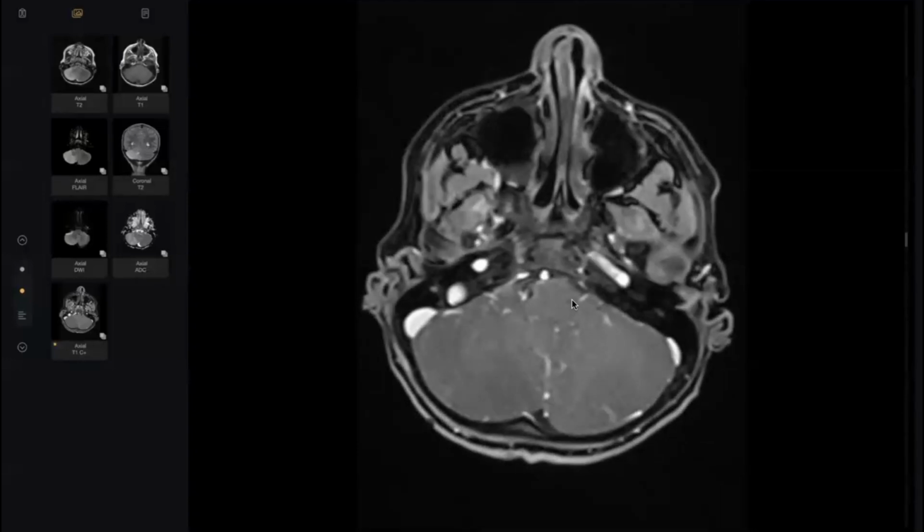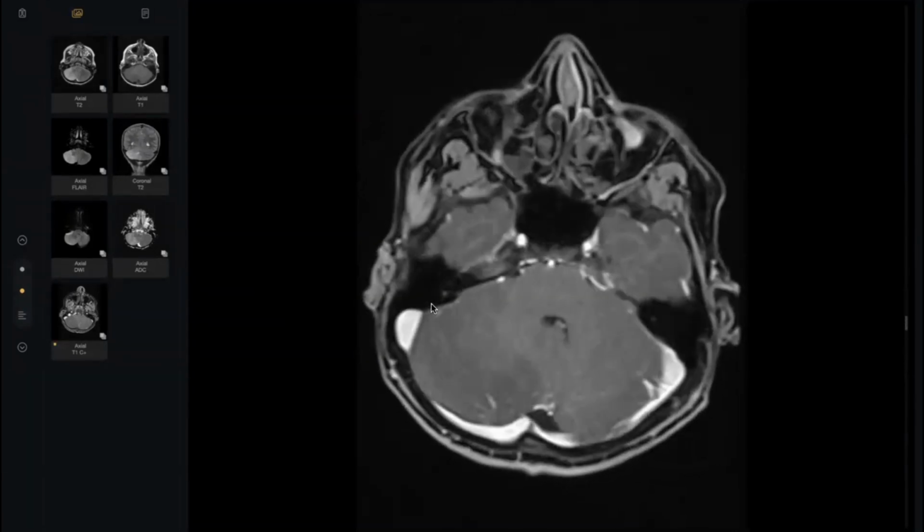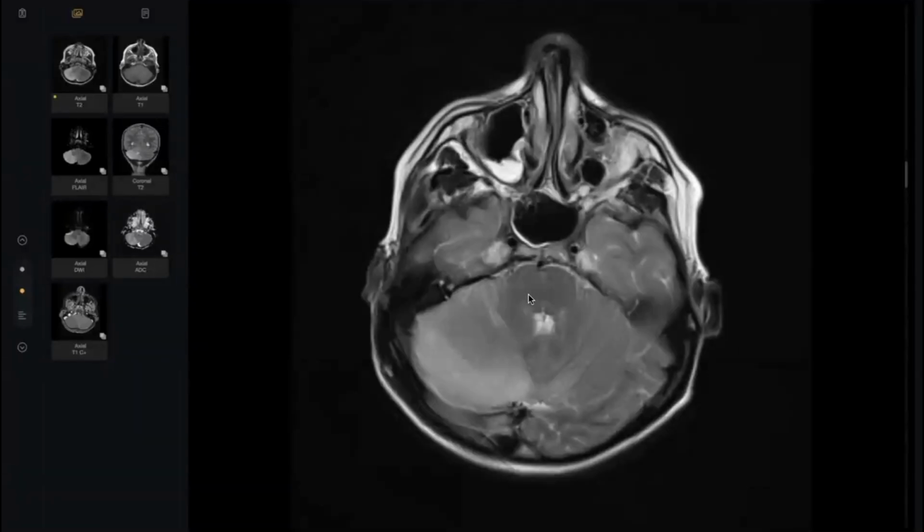See, in my experience, infection especially overall doesn't take a good degree of enhancement. It may take patchy, mild, or no enhancement like this. This is my experience. However, if you detect enhancement here, it will confuse you so much. Why? The same appearance may confuse you with Lhermitte-Duclos syndrome.